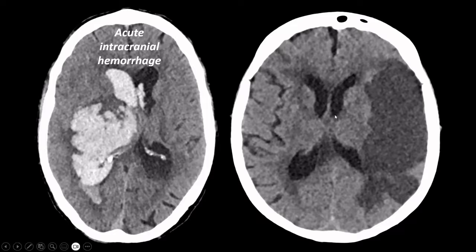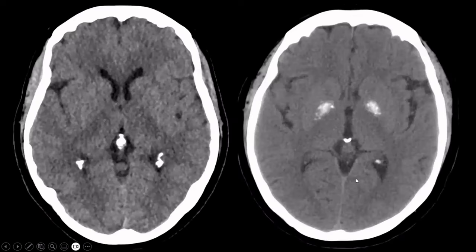This is a patient with an acute ischemic stroke in the territory of the left middle cerebral artery, and we see that the brain parenchyma here looks swollen and is very dark because it contains a lot of water. It's basically an area of focal cerebral edema.